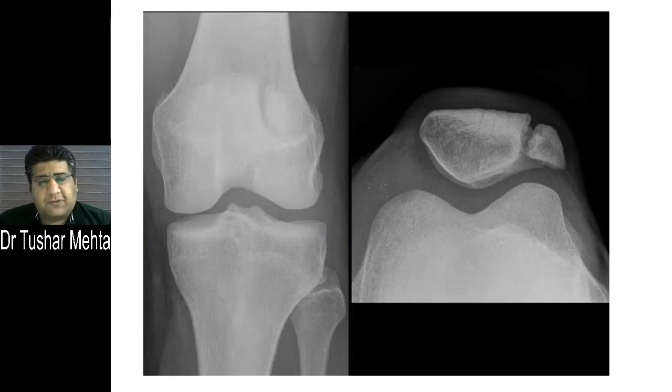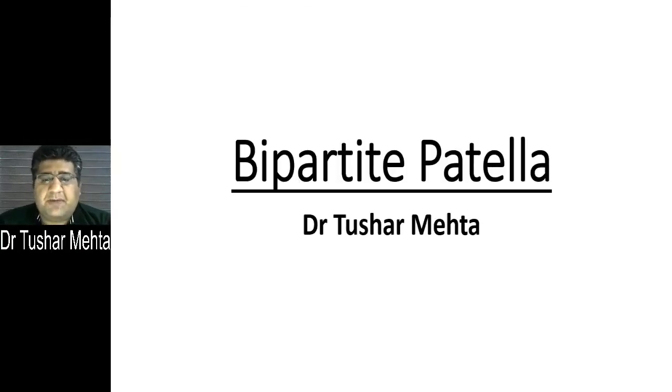When this image floats on any of the social media groups, the first thing that I often see, said by the PG aspirants, is that it's a fracture of the patella. Well, okay, but it is not. It is not a fracture of the patella. It is a condition called bipartite patella. Now we'll talk about this bipartite patella.